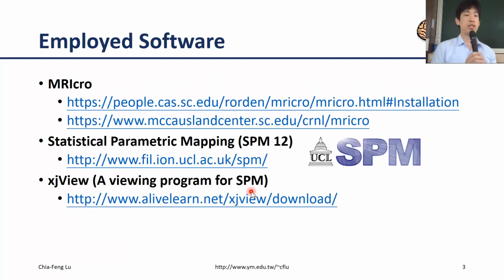And this is the list of the employed software today. It's actually the same software that we used last week, so you don't need to download any new software package right here. Just use MATLAB, SPM 12, and again xjView, one of the very handy and useful viewing programs for SPM.